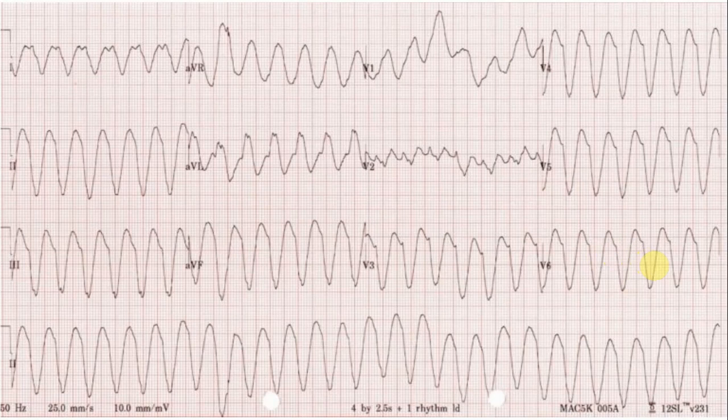Excellent, excellent. So that's really good. So that is a very systematic approach in reading the ECG. So if you look at the wide complex tachycardia, just don't get overwhelmed that this is VT, this is nothing else. It can be something else. The patient can have hyperkalemia, they can have tricyclic antidepressant overdose, they can have something else going on, they can have an MI. So you need to look at the ECG in a very systematic way.